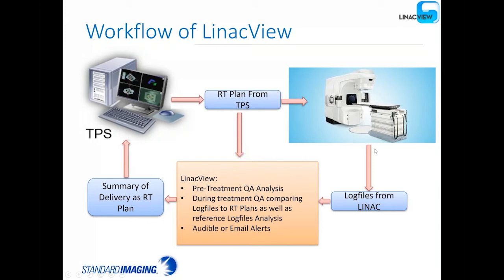Once the plan is delivered and the log files are acquired by LinacView through a synchronization system, LinacView automatically associates the log files with the RT plans that have already been retrieved at the time of the TPS export.